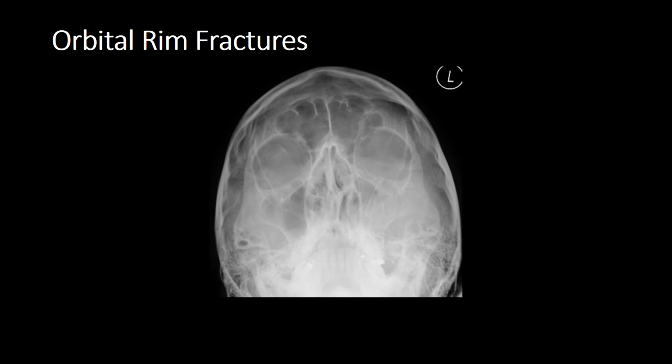Now, if we use McGrigor's lines, then we are assessing for alignment, bones, cartilage and soft tissues all at once. So let's do McGrigor's lines. Line 1, so we start at the frontozygomatic suture over the superior margin of the orbit, over the glabella, over the opposing side and the opposing frontozygomatic suture.